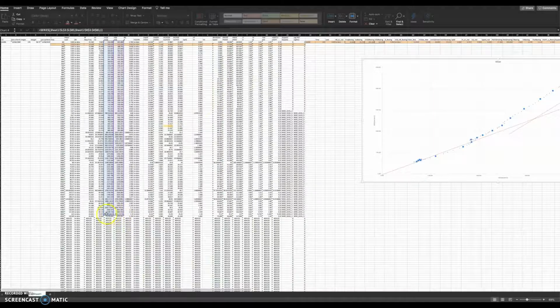In this case, I'll go for the second last one. I look at load, and the load was still high there. That's the highest. I'd never take the last one because the mask might be coming off or something funny might be going on. The next thing I look at is the revolutions, how quickly they turn the pedals, and that's 72. So I'll go for that. They're still turning the pedals there, so that's all okay.